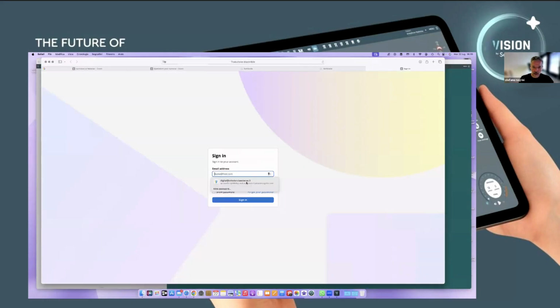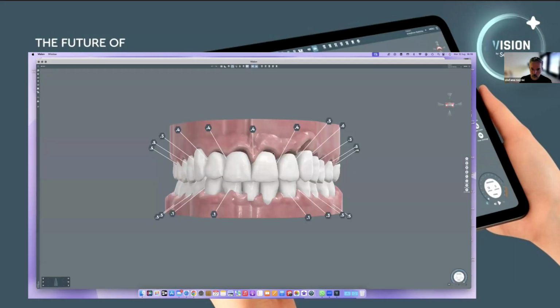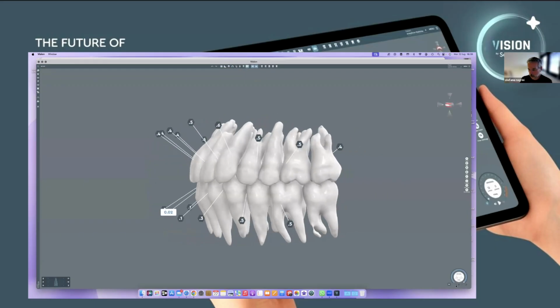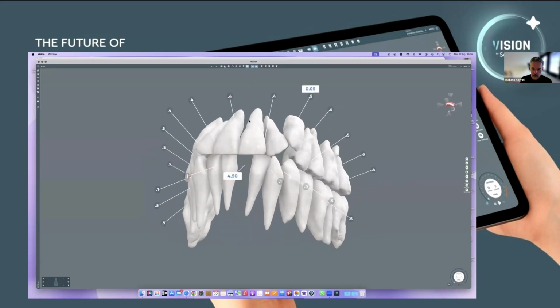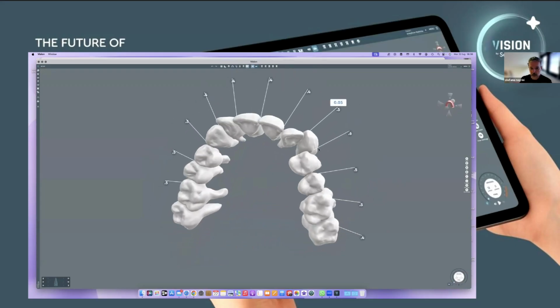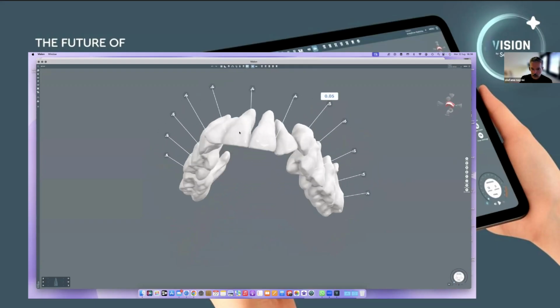Just a very tough case, just for you to understand the option to use this software. At the beginning there is no space here, and also the inclination of the two laterals is very complex.